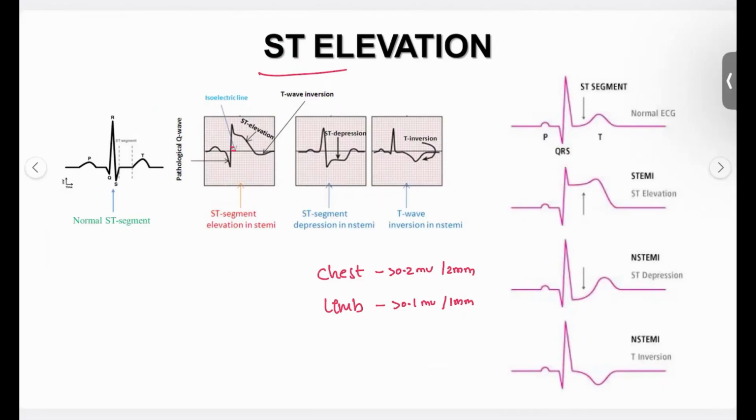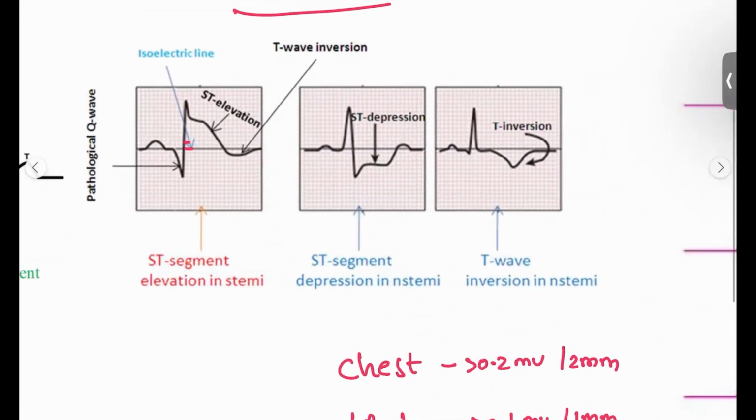All right, here you can see the ST changes that are classically seen in a STEMI patient. And in non-ST elevation, there will be ST depression or T wave inversion. So this is commonly seen in non-STEMI patients.